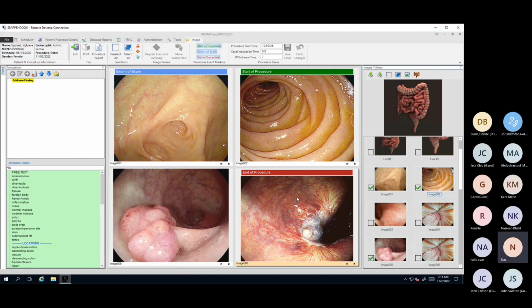And is there a way to modify this if, let's say, a person had a right hemicolectomy or something? So they wouldn't have a cecum, they would have an anastomosis. Right. Yes, you can. So in that case, that would be your extent, right? So that's what you would use. Whatever is the extent that you can go, basically, that's what you would use. Does that answer your question? Yep, thank you. Perfect. You're very welcome. And then you can state on your report that the patient had an anastomosis.